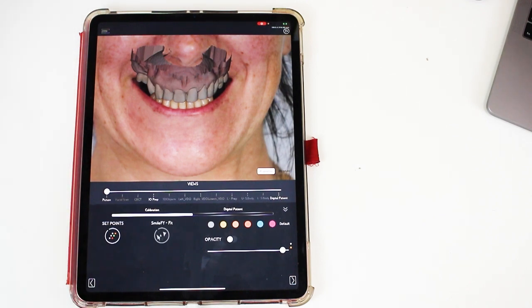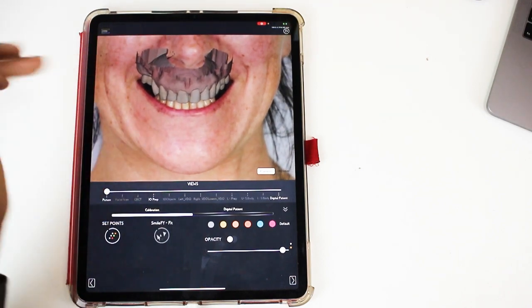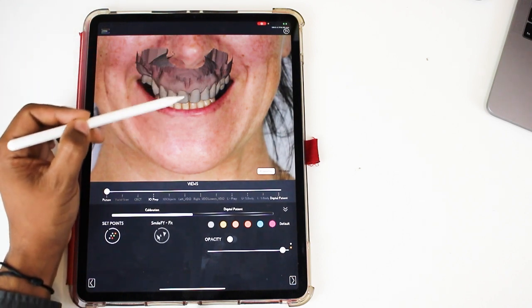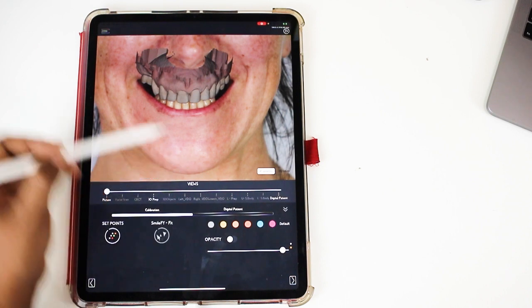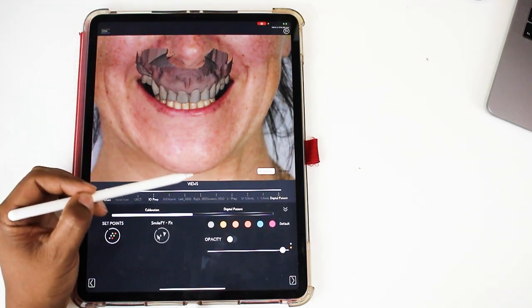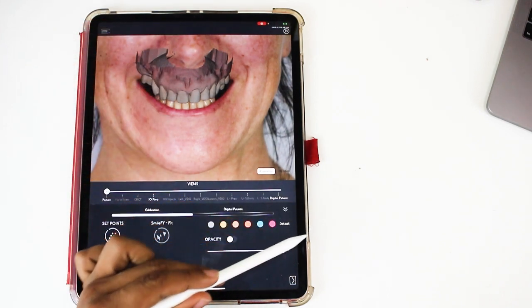Here, the patient's identity is hidden, so I'm not going to show the patient's full face. But just by looking, for example, here at the patient's nose bridge, philtrum, and chin, I can already understand that my patient's facial midline moves towards the right side here of the picture.